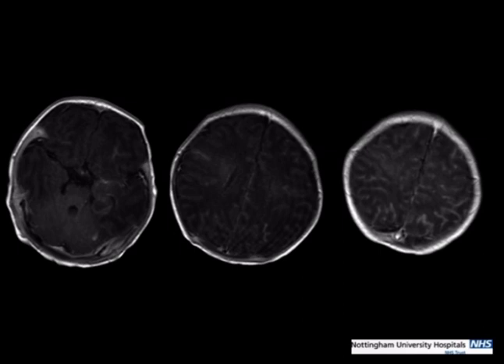This is herpes simplex encephalitis, and the type 2 herpes simplex that infants and neonates get has a different distribution to the usual pattern that we see in older children and adults involving the temporal lobes. It does involve the temporal lobes commonly, but it also involves all of these other areas, particularly watershed areas in the cerebral cortex, and the cerebellum, in fact, is involved in about half of cases.